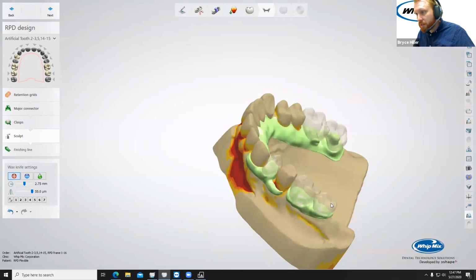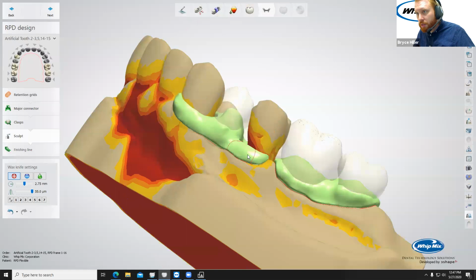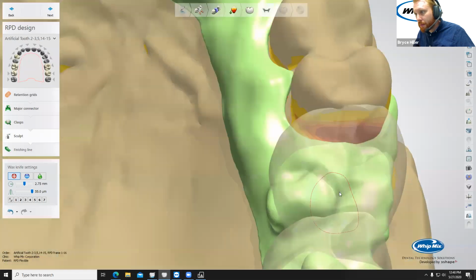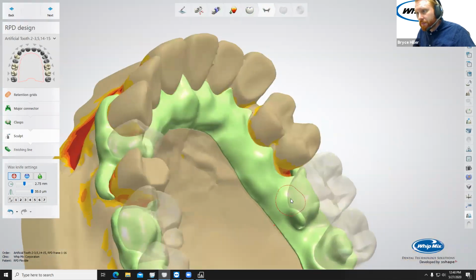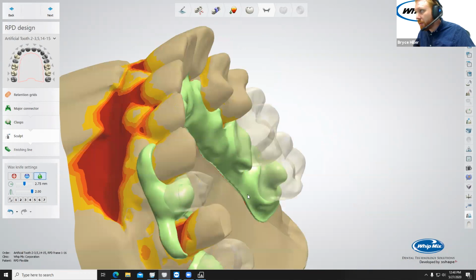So make sure this is totally filled. I don't want any space. Okay, so at this point, I'll grab my smoothing tool and start to clean things up a bit. I'm not gonna smooth out in the middle because that's all gonna get cut.